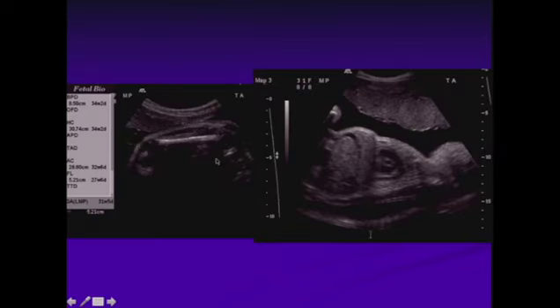You look at 31 weeks, and here's a femur. It's still straight, but it's now starting to drop off the growth curve. If you look at this date here, it's 27 weeks, 6 days, whereas her age by dates is 31 weeks, 5 days. So it's now about 4 weeks behind. And this is pretty classic for heterozygous achondroplasia, where it looks normal early and starts to drop off the growth curve at about 27 weeks. You look at the chest here, and the chest size is normal.